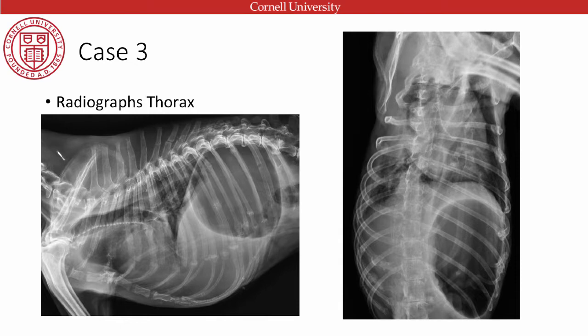However, we do have fractures of her spinous processes in her caudal thoracic region. There's one complete fracture here and one complete fracture there. They're moderately remodeled. However, they haven't formed a big callus. Now, the reason they haven't formed a big callus is that they haven't got much strain on them, like ribs, I suppose. So these can sit in a reparative phase for a long time, the transverse processes. These ribs are trying to heal as well. So one rib fracture here, one here, one here.